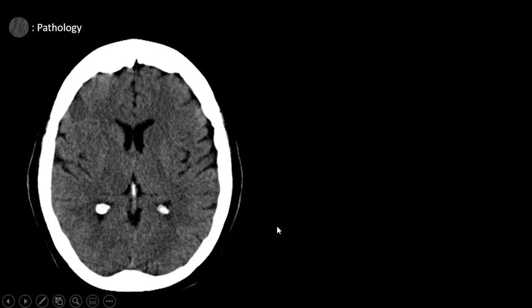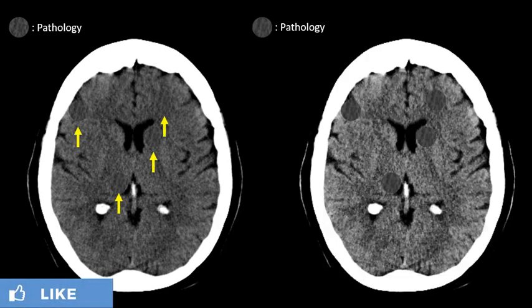However, look what happens when we change the window, when we change the background, or when we make the contrast resolution of the system better. Now, those pathologic structures show to a significantly better advantage. And this is what we mean when we say that we have to choose the window level that shows the anatomy or the pathology to the best advantage.